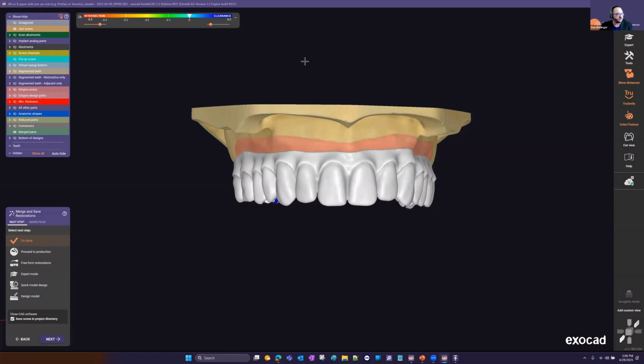And then when you're in freeforming on the anatomic tab, when you're utilizing the presets, those presets are just looking at specific areas of the library. So you can hold Shift while you're utilizing those presets and grabbing and pulling material. If you hold Shift, it's going to scale that aspect that's highlighted in green.